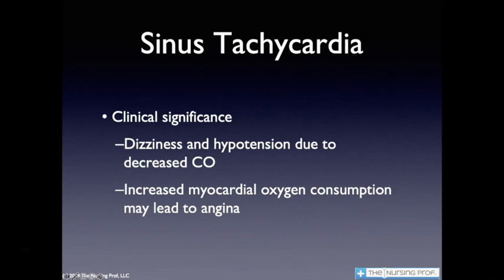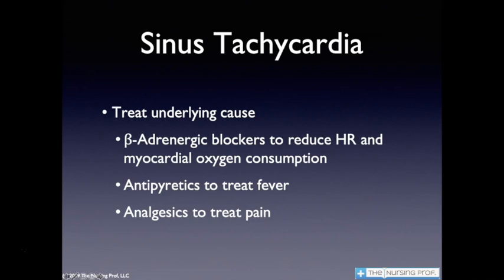The clinical significance of a sinus tachycardia could be dizziness and hypotension. Now, the decreased cardiac output piece or the increased myocardial oxygen consumption, those situations are likely to happen in people who have underlying cardiac disease. It's not likely that healthy people are going to have these kind of symptoms as a result of a sinus tachycardia. We want to treat the underlying cause. The underlying cause usually is going to be that the patient's having pain, the patient is having a fever, so we want to treat those problems.